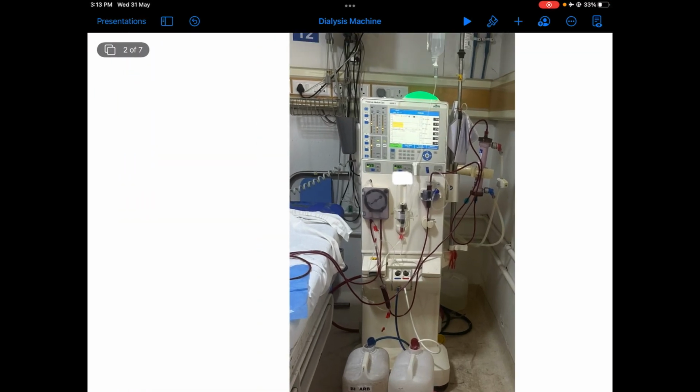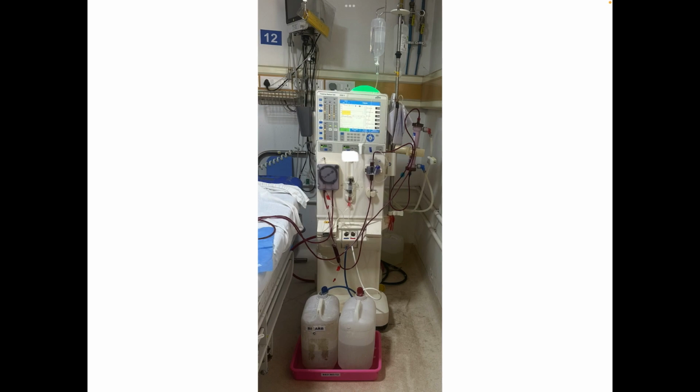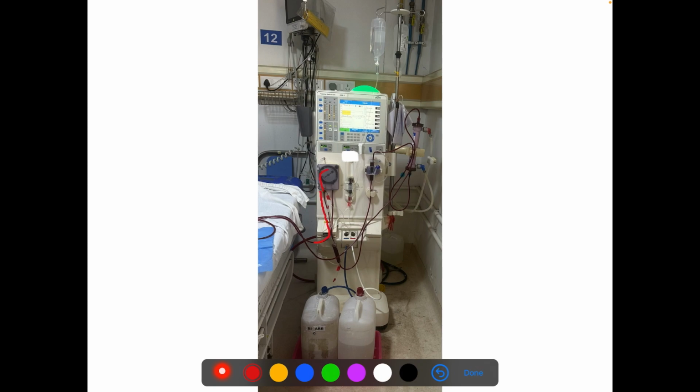We can see this one again similarly coming from the patient, pre-pump. This is the pre-pump going into the pump and coming out. Here we can see one air trap. That machine did not have it, but this machine has an air sensor and an air trap. Any air particles that can be present in the circuit because of a break or because of inadvertent inflow into the circuit can be trapped here and is released into the atmosphere.